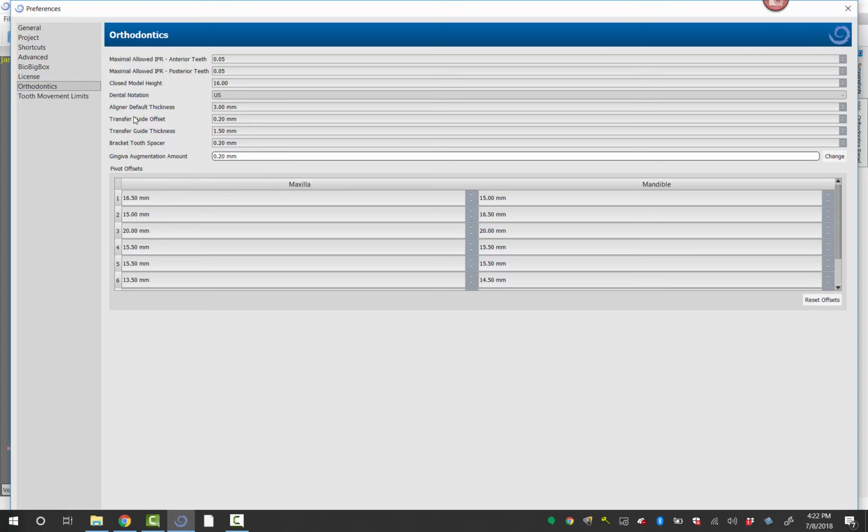When we get to the point where we can eventually print aligners, that's not really available right now at the time of making this video, which would be July 8th, 2018. Who knows what's going to happen in the future, but for now, this is just there ready and waiting. And then the rest of them had to do with the indirect bonding trays.